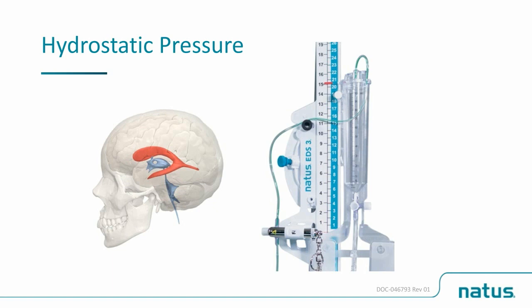Drainage occurs when the pressure inside the head makes pressure in the fluid column, here the CSF in the ventricular catheter, greater than the pressure or weight of the CSF in the drainage system. We regulate this drainage, and hence ICP, by raising the drip chamber to a certain height to create a pressure gradient, or an uphill, that the CSF has to overcome.